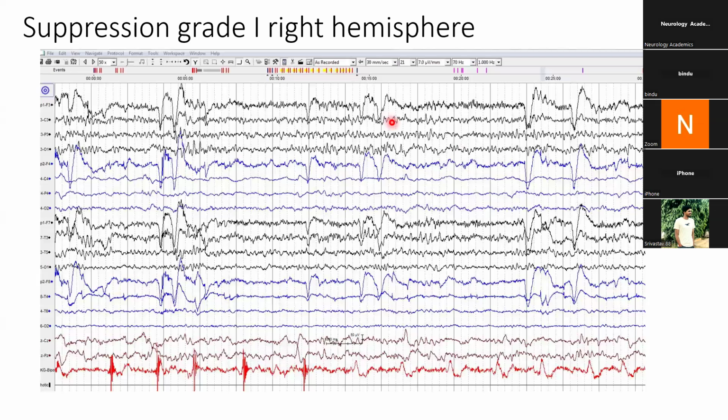If you do not know, asymmetry grade 1 or grade 2 increased left hemisphere, because there is an overexpression of the fast activity, which is not at all a common feature in the normal EEG. This much fast activity is not going to be there in your routine EEG reading practice. Another way of going about this is that the patient is probably on benzodiazepines or barbiturates.